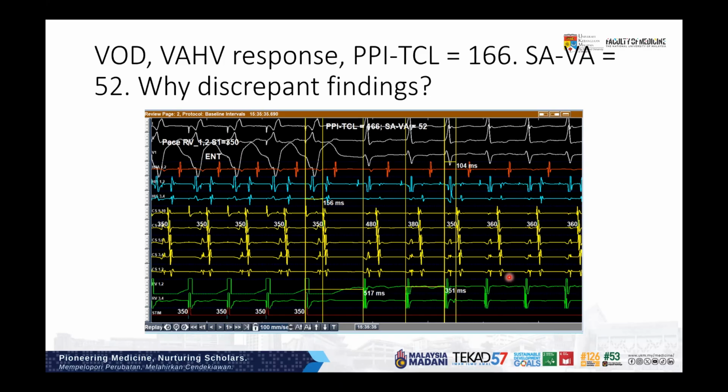If you have a slow AVNRT, your CS wouldn't be that sharply eccentric, because CS proximal 7, 8 and so on should be almost a curved shape. And also not much different. So as for coronary sinus activation, if your CS is in the proper place, just looking at the CS activation, you can start thinking this has got to be a pathway, not AVNRT, okay?